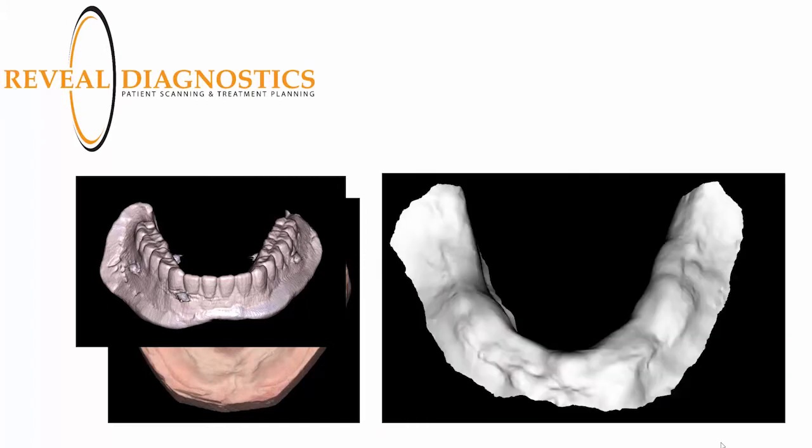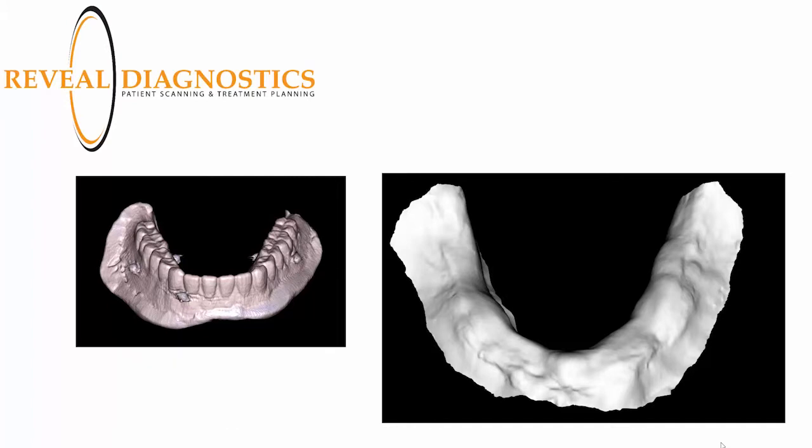While CT scans are great, they alone are often not the best solution to have predictable fitting guides. Almost every guide company will use a stone model or an optical intraoral scan to create the fit of your guide, just because we can get much higher accuracy by using laser scanning tools.